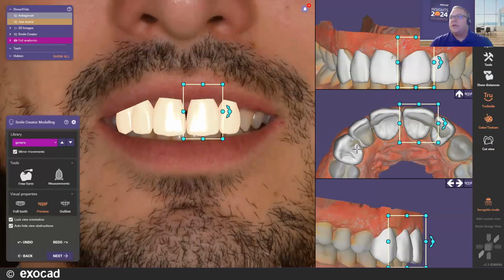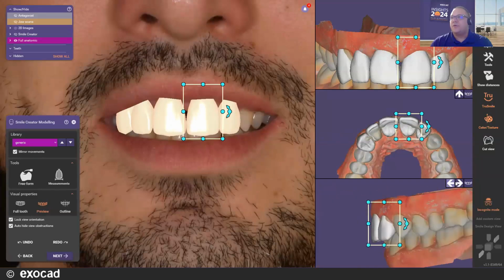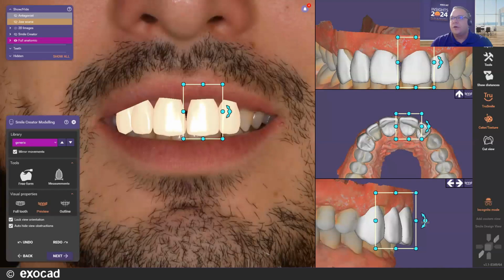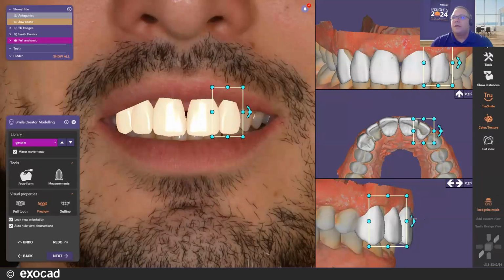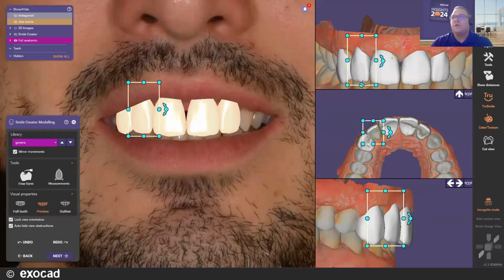Now I'm starting to see some areas that I want to change with my laterals. Potentially I want to come in another viewpoint, and I'll recenter here with these directional arrows, cycle through the case, and see all the aspects that I do want to change. Maybe I want to roll my anteriors a little bit more towards the incisal edges of the existing teeth. Do that for my laterals as well. Change positioning from a gingival standpoint, and maybe correct some length as we're going through also.